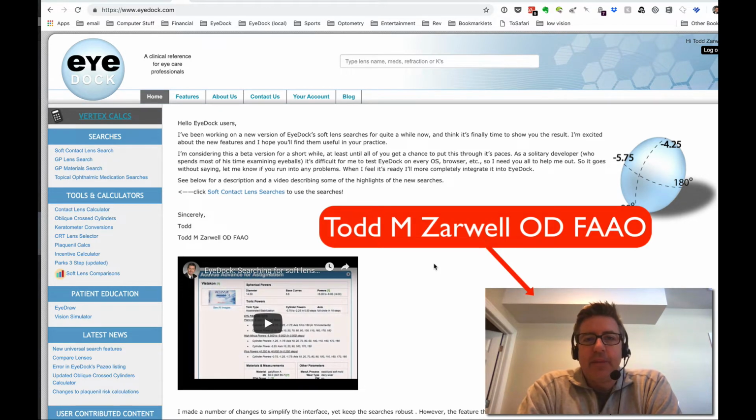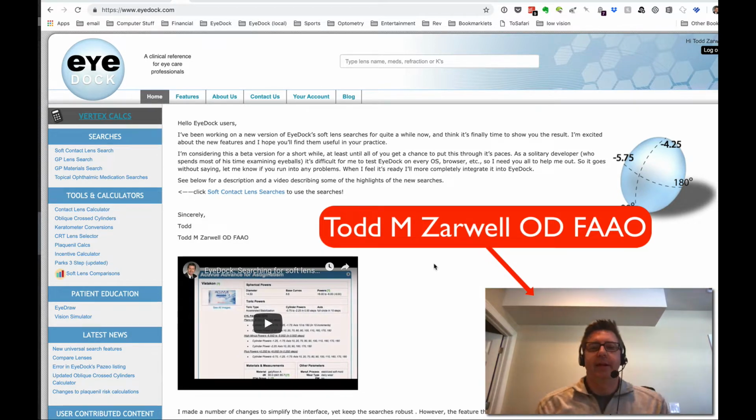I'm the developer of EyeDock.com, and one thing I'm really horrible about doing is working on the website, but not really marketing or telling people about the things I've added to it. So I'm going to try to rectify that with a short video here. I wanted to talk today about comparing contact lenses.